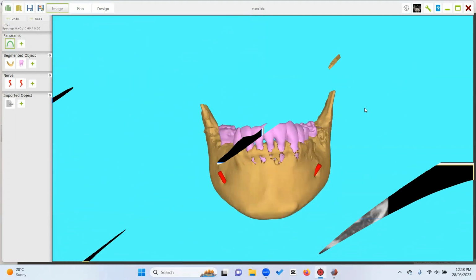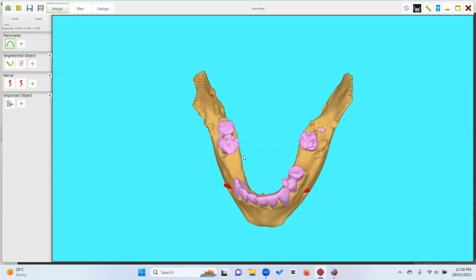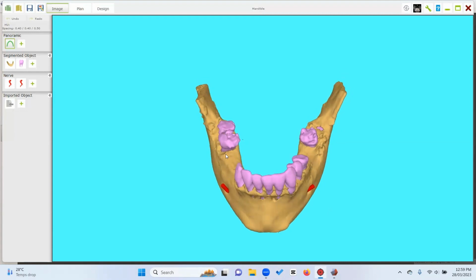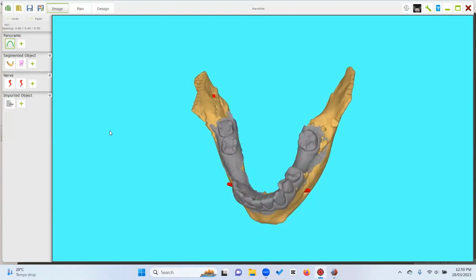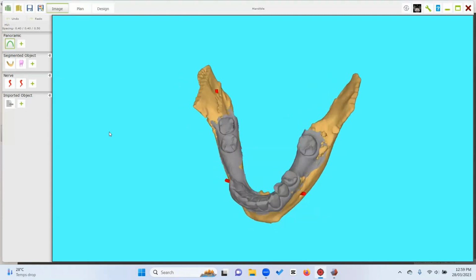So what you see on that 2D, you see that we have the teeth and we have the bone. But the guide is not designed on that because of the quality of the CT scan. The teeth are not perfectly shown in the 2D and in the 3D. So what is being added is the cast of the patient. And you see the cast has been overlaying, and now you see that the surface of the soft tissue is in that. But we don't want the soft tissue.